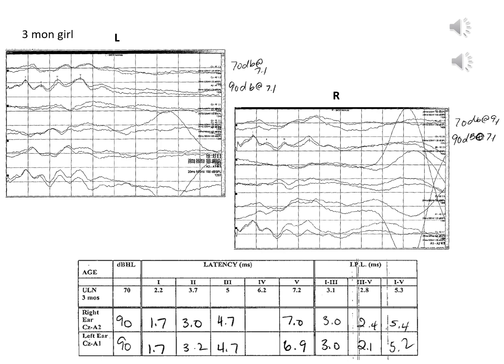And so this would suggest to us that there's an overall brainstem delay that we are able to observe in the right ear. And so this would be an abnormal study with increased interpeak latency between waves 1 to 5, suggestive of a brainstem delay.